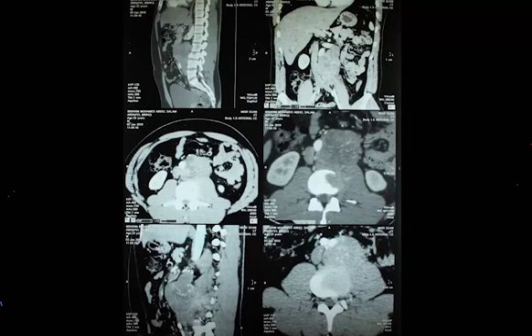What is the region that you see? You almost always get to the axial cuts. Your axial cuts are the very original ones. There is a hypodense lesion, 5-7 centimeters. Okay. Where is it? Is it homogeneous or heterogeneous? Heterogeneous, beside the aorta on its left side.